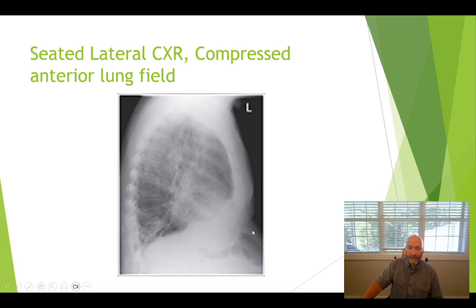But what happened here is that they set this patient up so much that the contents of the stomach and the abdominal cavity, not just stomach, compressed the anterior lung field, so it couldn't inflate very well. So again, ladies, if you've ever had kids, and you try to sit up at a 90-degree angle, that baby pushing on your inferior lung field would kind of give you that same sensation. So it compresses the anterior lung field, and it prevents good inflation.